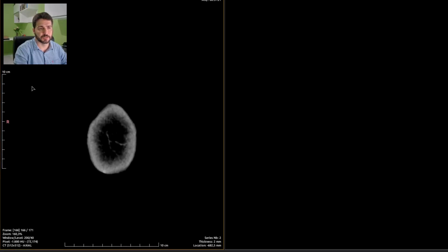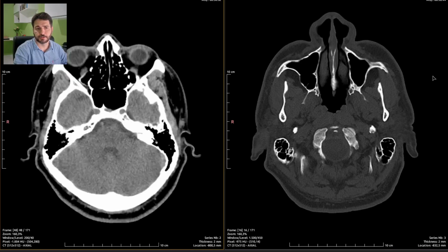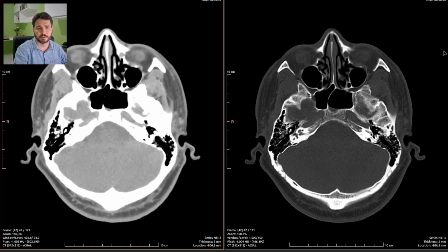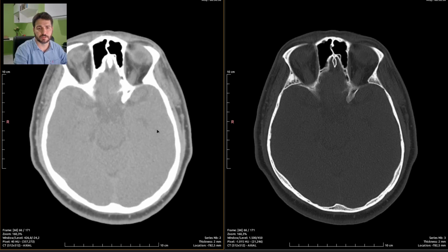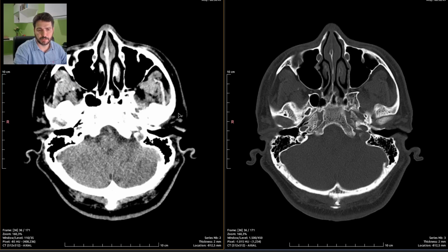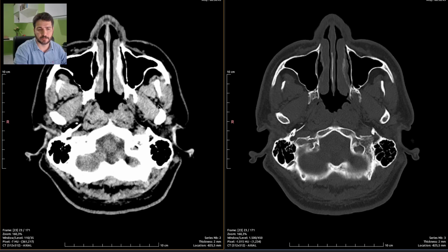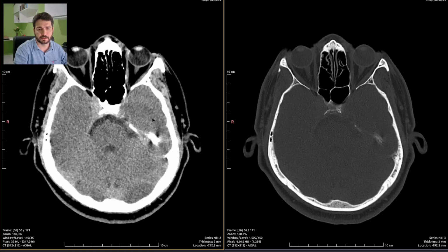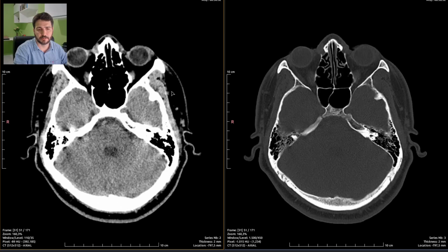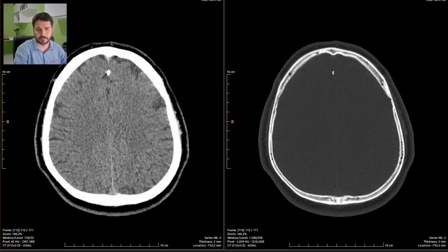We're going to put a soft tissue window right next to the bone window. Soft tissue. This is an old scanner. This is a poor quality scan. Patient shook his head while scanning the posterior fossa. So this is even worse. But I guess we can see major disease if there are any signs of it.